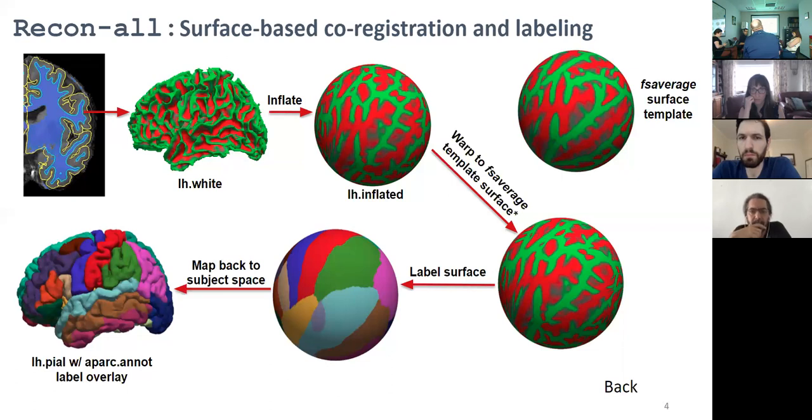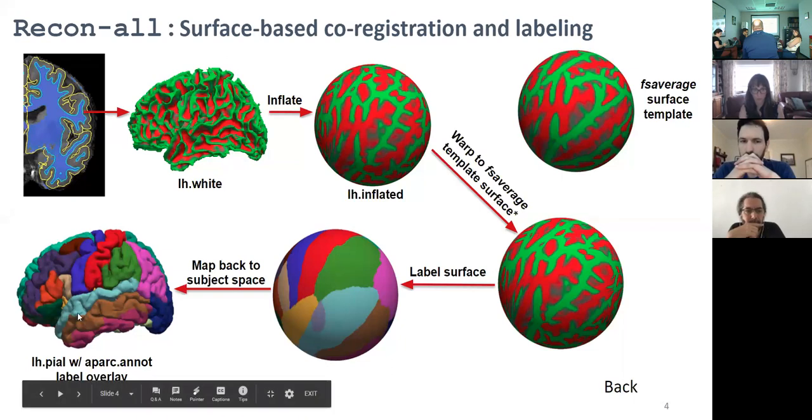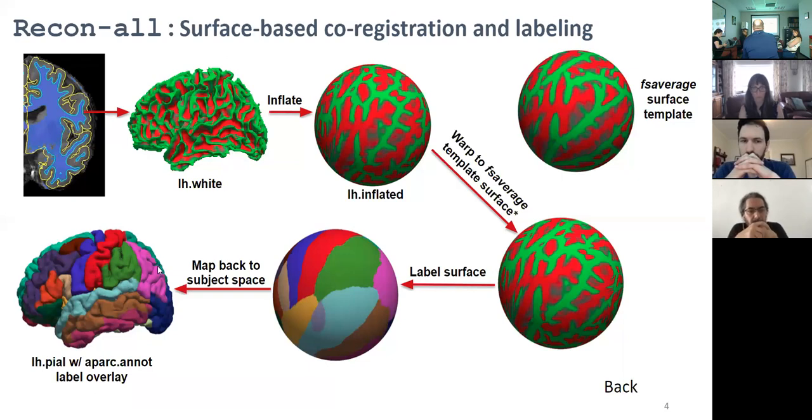Well, the user of FreeSurfer doesn't even know much about any of that, right? Right. This is all if you ever needed or wanted to do that. In terms of the pipeline, FreeSurfer will automatically do all this for its default parcel labeling systems. It has this gyrus-based labeling system here, and in terms of what information it needs for that, you need a good recon with the surface curvature.